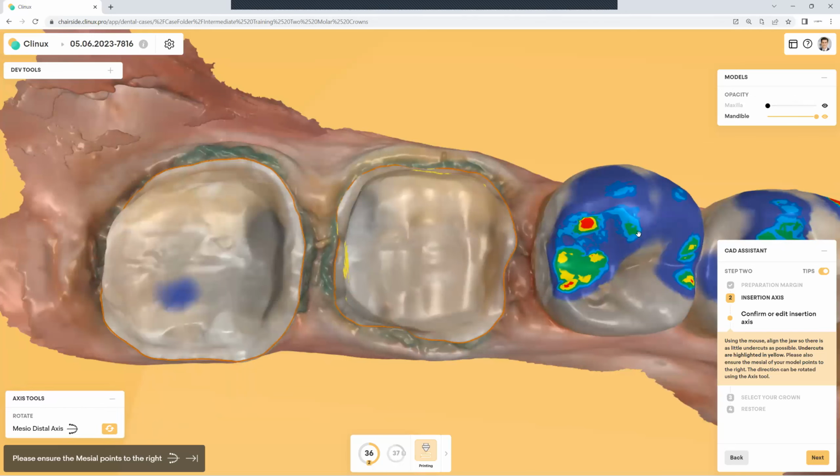So now I'm going to grab the circular shape instead of the subtract, because look at the size of the surface. It's a big surface, and I have to move the whole thing back, and I don't want it to look like a potato. I don't want strange concavities. I've made the circular shape about the size of half of the tooth. Now I'm going to grab the center of that red spot and push it back. You see, now the cusps and the marginal ridges are moving back as well, so I'm not going to get a strange shaped tooth when I'm done editing. So there I've got a nice contact surface.